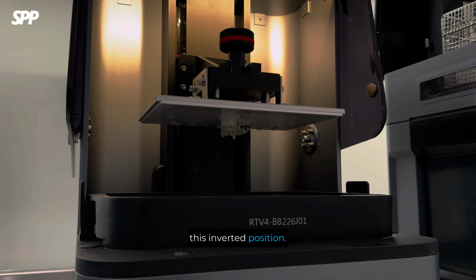This scan data was created using virtual extraction. Since only the teeth were deleted, the gingival contour was not reproduced. In the CAD software, I could press the data to form the gingival contour. Normally, scan body data is acquired after the implant is placed. But because the fixture position is already known, we can extract it in advance.